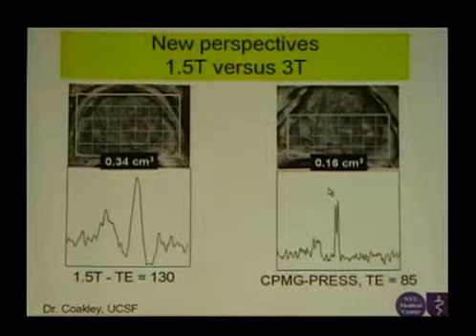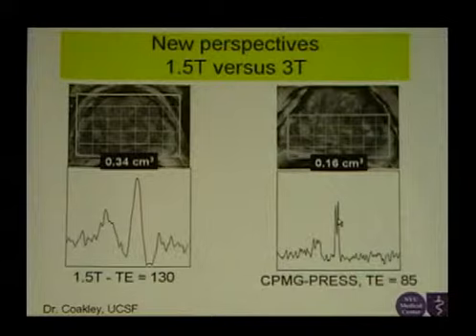The same patient also had spectroscopy, and you see, first of all, that the spectral resolution is much better. You see here the citrate peak is a doublet, basically, which is a normal appearance. When you do ex vivo spectroscopy at high field, you're going to see that the citrate is, in fact, multiple components. It's not like one peak. It has like 2 or 3 peaks. And you're able to see that with this spectroscopic sequence at 3T. And you have also better voxel size.